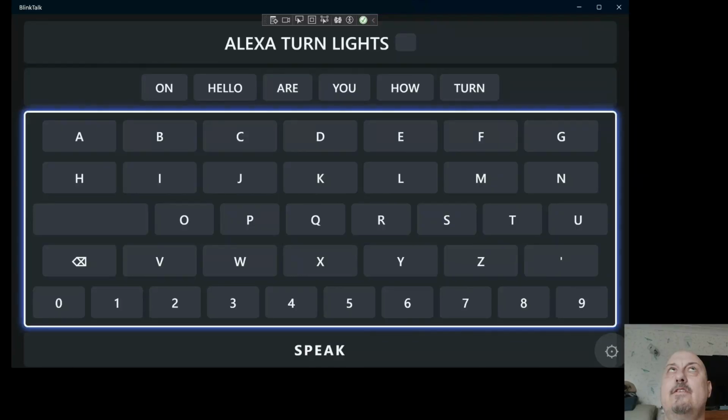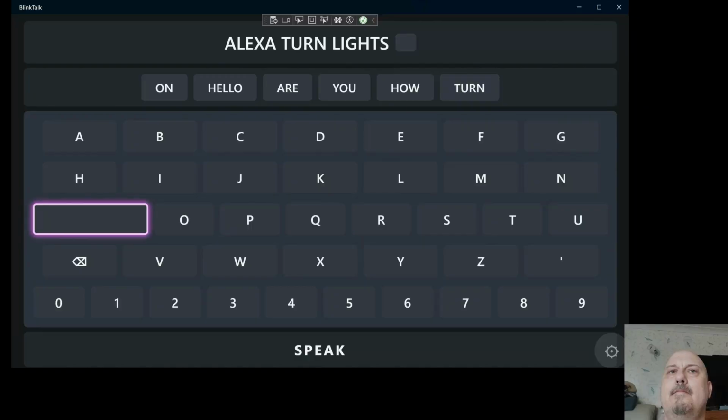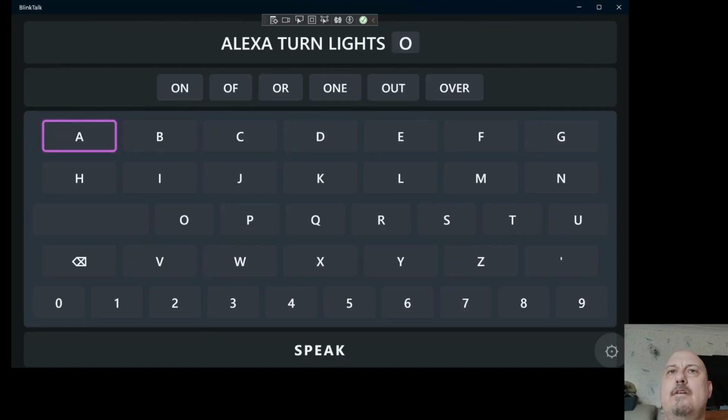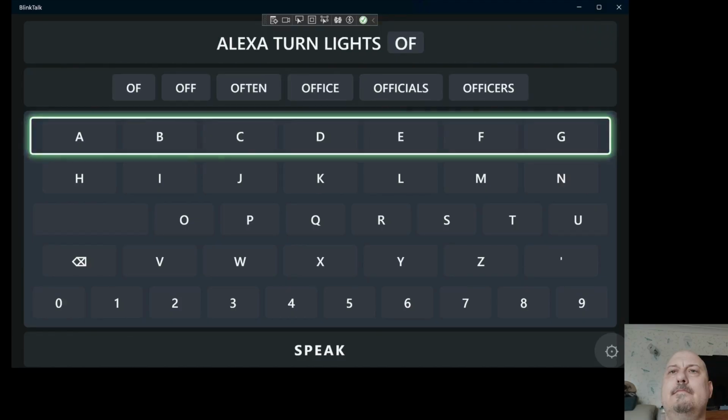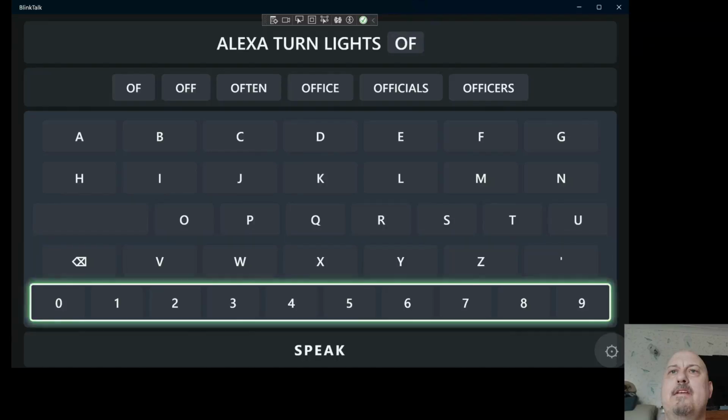Alexa, turn lights. O, F, F. I should have gone straight back into that, that would have been better.